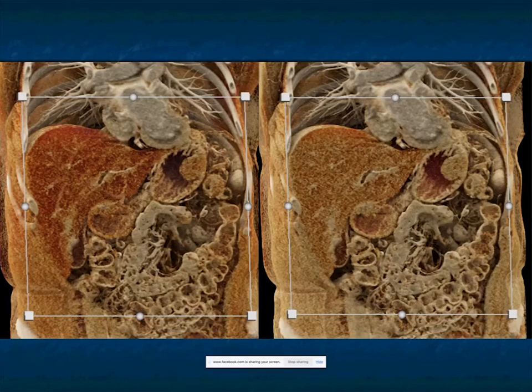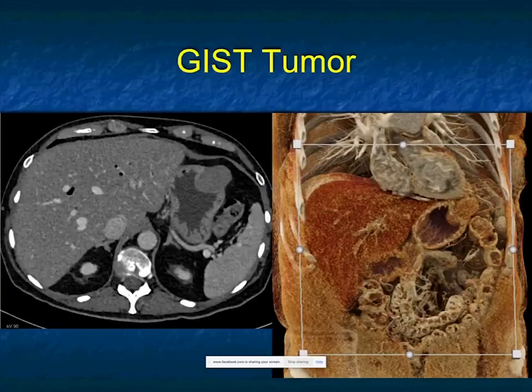Could it be a polyp, just a simple polyp? Well, that's unlikely because it's also extraluminal. Is it an adenocarcinoma? It's usually infiltrating. Then lymphoma can be bulky, but things that go both intraluminal and exophytic, you're typically thinking about gastric GIST tumors. That is going to be the most likely and is in fact the diagnosis. So just a great example of that.